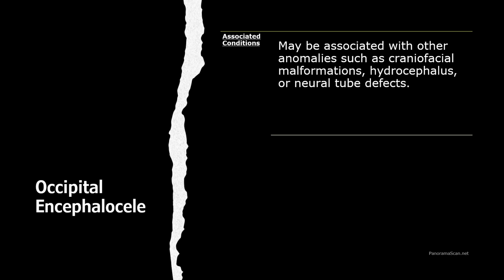Recognizing these associated conditions is crucial as they can significantly impact prognosis and management decisions. Advanced imaging with 3D and 4D ultrasound allows us to detect these concurrent anomalies early, providing a more comprehensive view of the fetal condition and informing a multidisciplinary approach to the care.